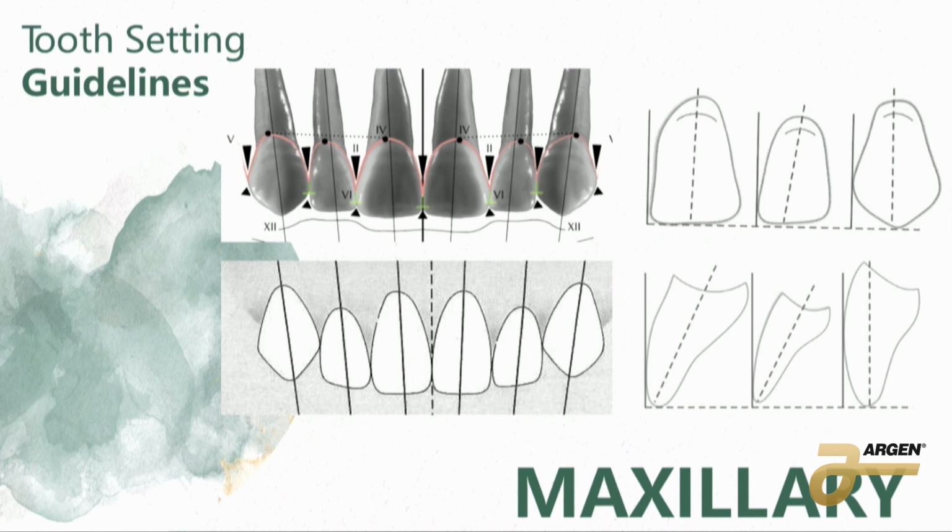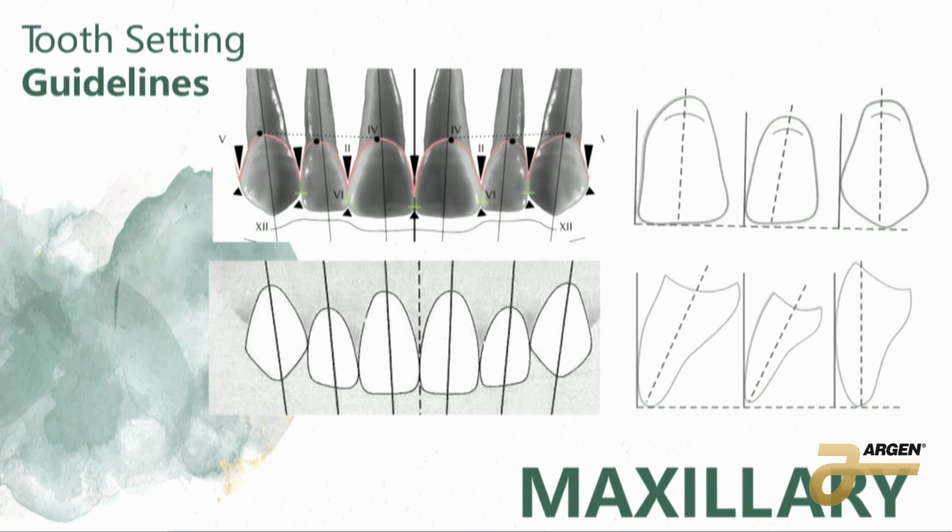And I don't disagree with that per se, but if we're teaching them foundations and we know how to teach them foundations in a digital space, it's okay. It's okay that they have a setup of teeth that comes in kind of pre-done for them, as long as we're showing them how to make adjustments, how to move things, and why. We need to be explaining why, or they're not going to grasp that, right? They're just going to be clicking buttons. We need to be explaining the why. So that was the uppers.